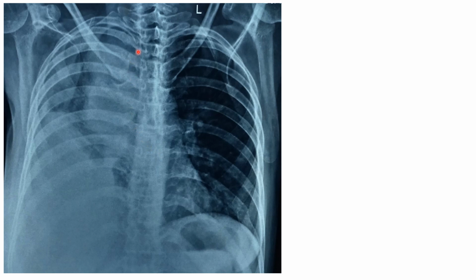This X-ray is a bit tricky. Here is some mass lesion, and this lung is kind of compressed here, and there is also an effusion up here. So it is multiple pathologies, and it looks like a whiteout, not a complete whiteout, partially whiteout. The lung is up here, so sometimes you can encounter similar kinds of features as well.